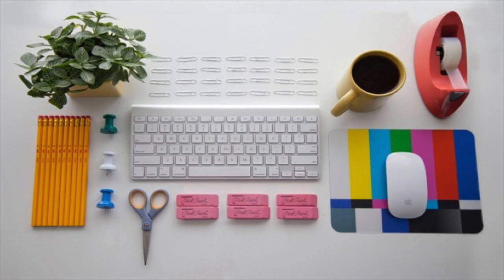Now I want you to take a look at the next slide and tell me if it's organized or disorganized. Organized. It's not symmetric, but it's organized, and that's the difference. We're not talking symmetry here. We're talking about some natural order that our brains intuitively know is a natural order.